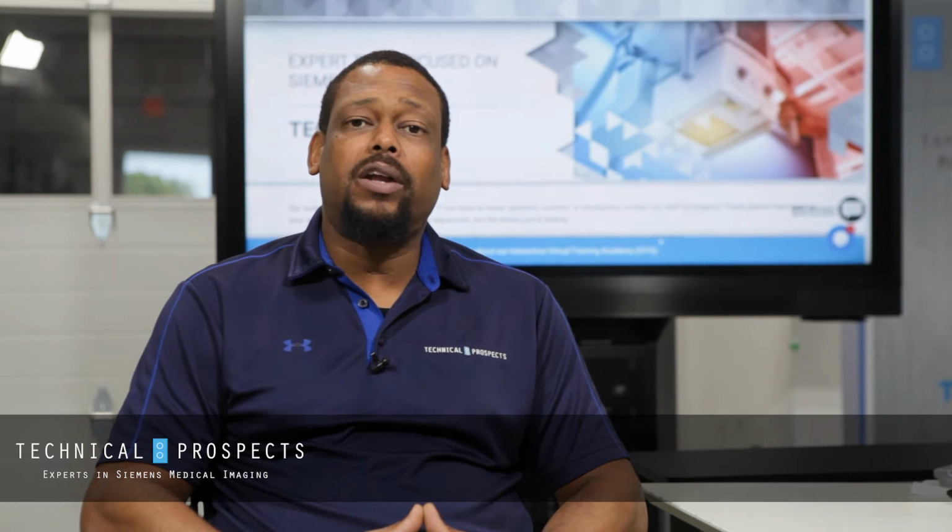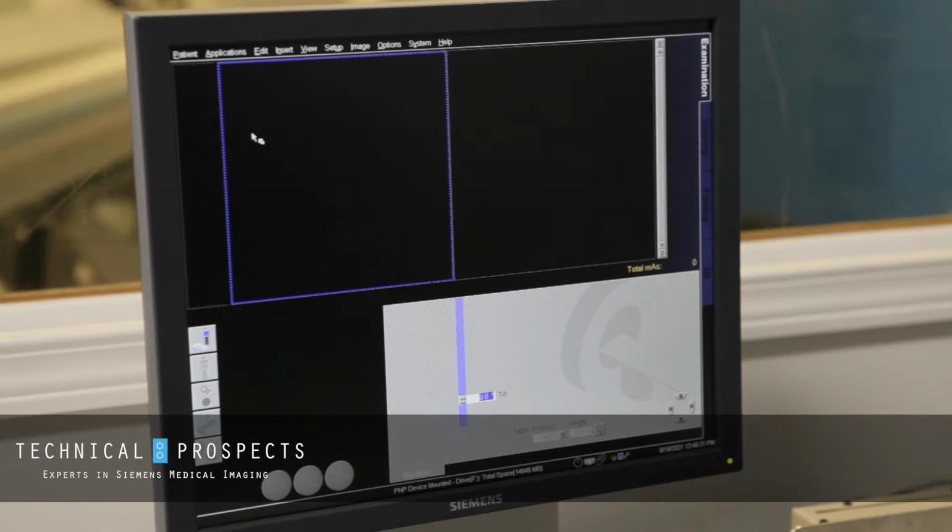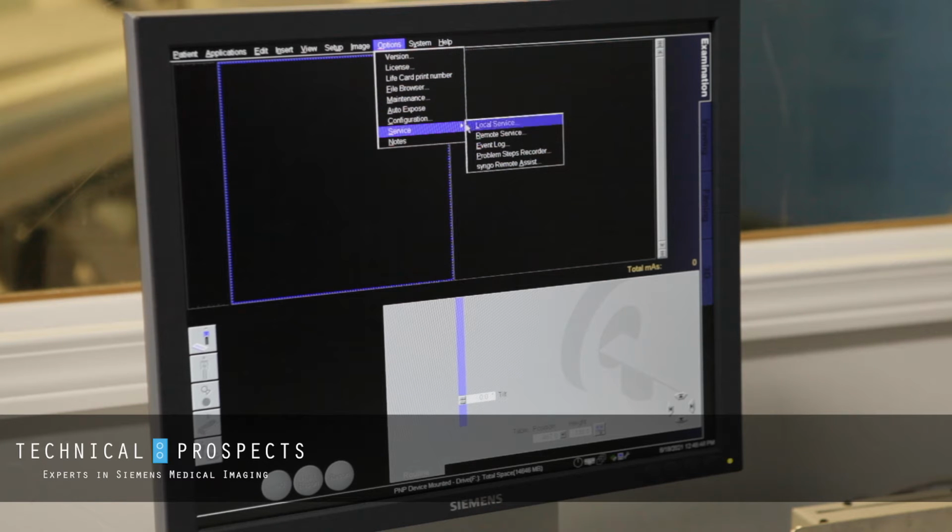Today we'll be discussing how to access the customer event log. The customer can actually access the event log without going into service software. All they would need to do is go to Options, Service, and go straight to Event Log.